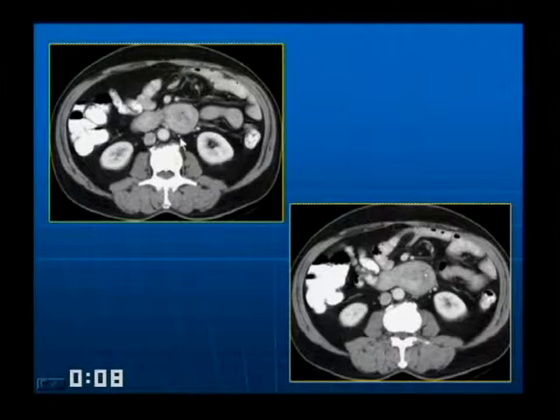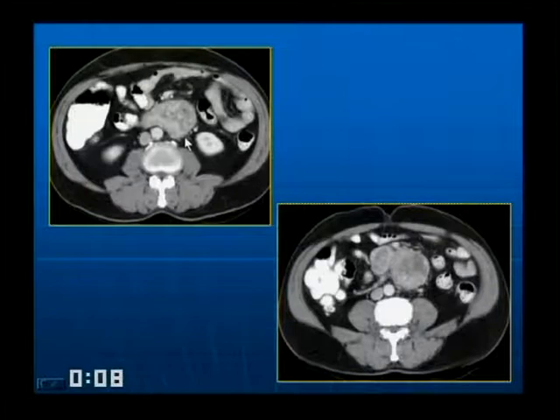It certainly has a large lobular mass involving the transverse portion of the duodenum, and on the images a little bit further down you can see a little low density that sort of looks like fluid in the lumen, maybe some contrast getting trapped. So hard to tell, but it is in the distribution of the third portion of the duodenum. So what sort of things would you put in your differential diagnosis? Well, think about Claire's lecture. What's the differential for masses in the small bowel? And try to tailor that differential down and ask yourself what it might be in the duodenum.